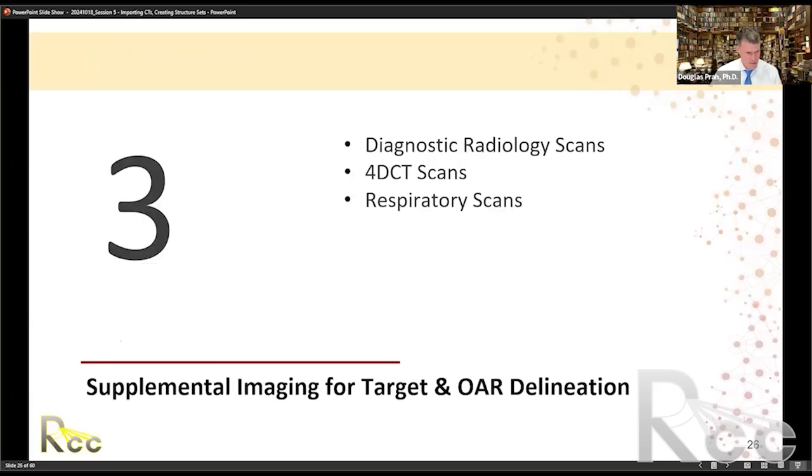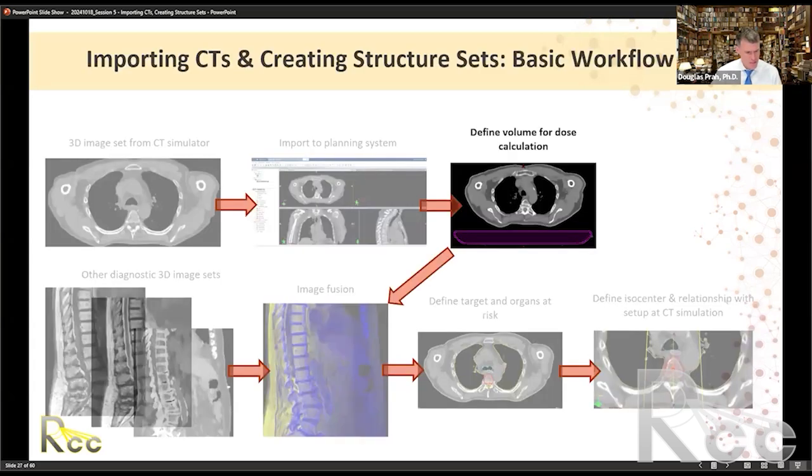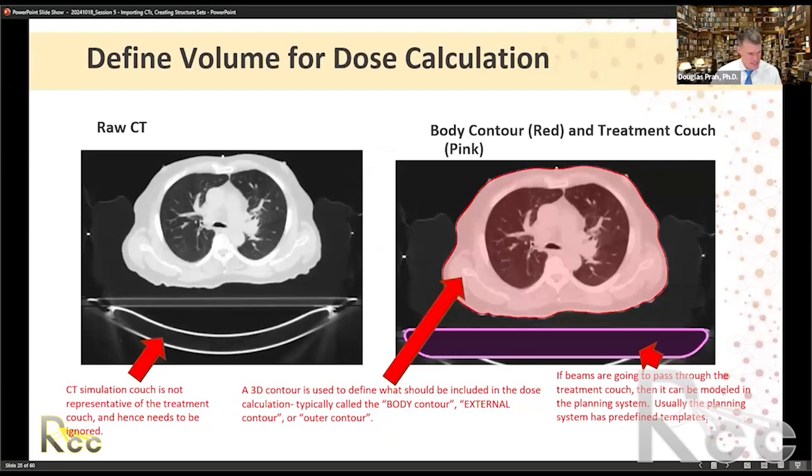So there you go. Let's move on. Now that we have a CT scan loaded into the system, there might be other CT scans, either from radiology or from the CT scanner, that we want to pull into the planning system. So let's take a look.